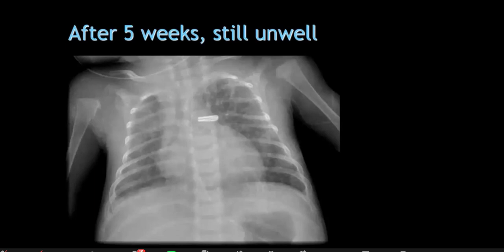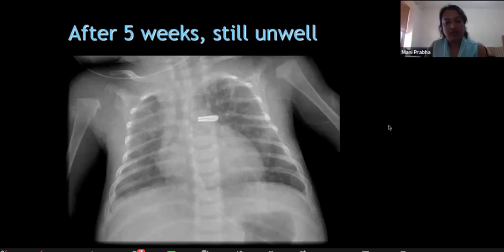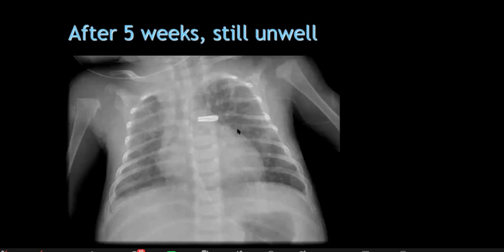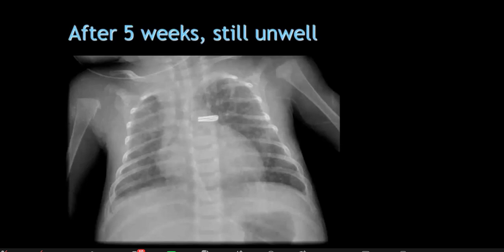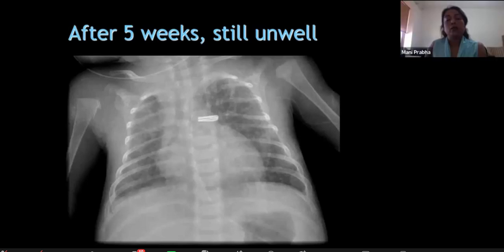So what is this? That's the foreign body. Anything else? A surgical clip. A surgical clip for what? Any cardiac issue? So this is being shown to you so that you're familiar with this. This is a PDA clip, and PDA is open in preterm infants. So this gives you a clue that the child was a preterm child. This is a big clue.